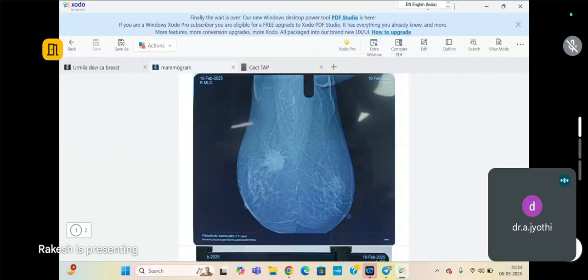First patient details are important. Then the indication as well, whether it is screening or diagnostic. Then we will tell whether it is adequately taken or not, and the exposure. After that, if it is adequate, go from outside to inside.